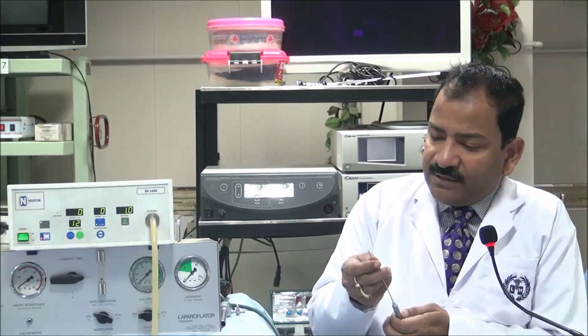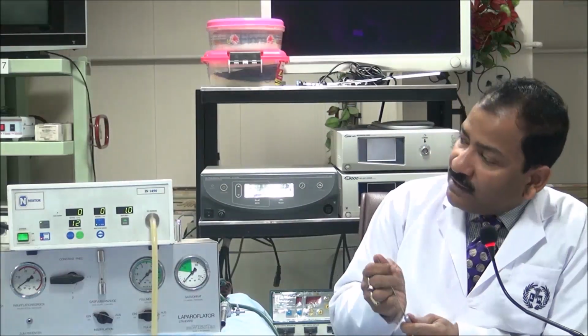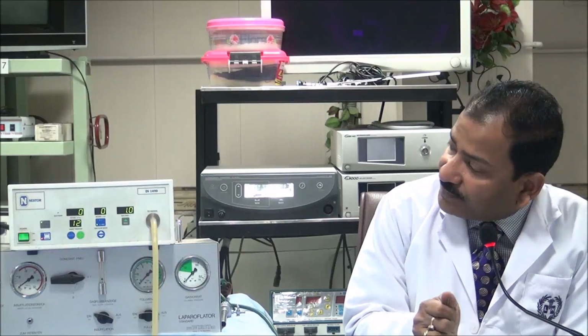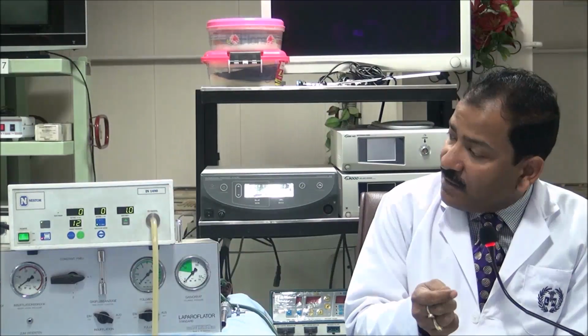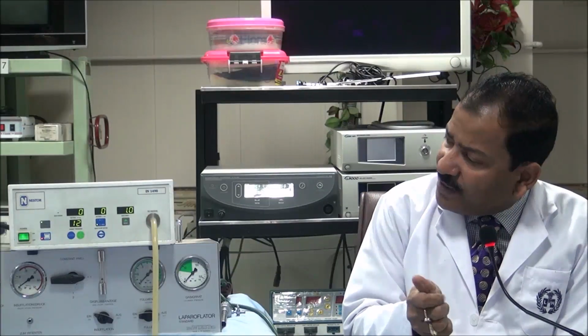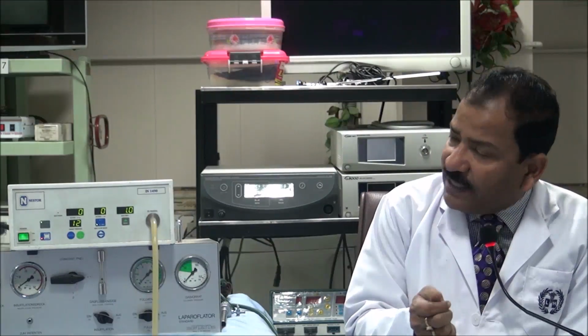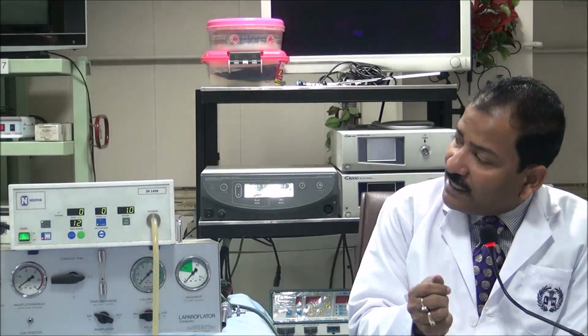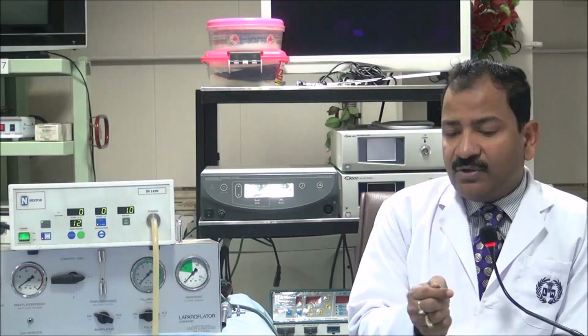Because sometimes this negative pressure can be achieved just by rubbing your finger over it. I will show you. Within a few seconds it will give you negative pressure. I am just rubbing over this and it gives it. Sometimes it doesn't, but many times it does. So that's why it is always better to use your own suction irrigation and hanging drop test. So this was regarding the insufflator.